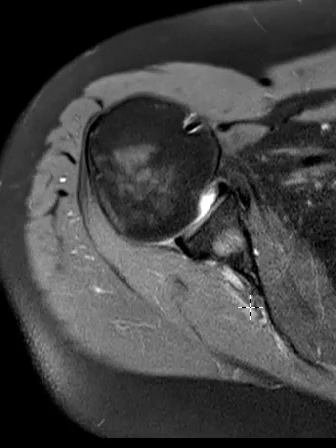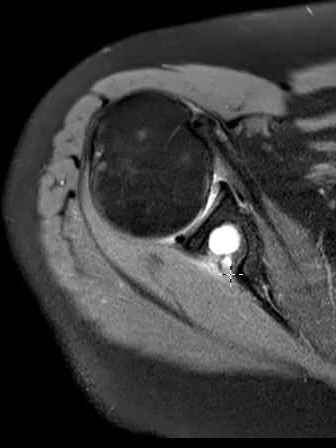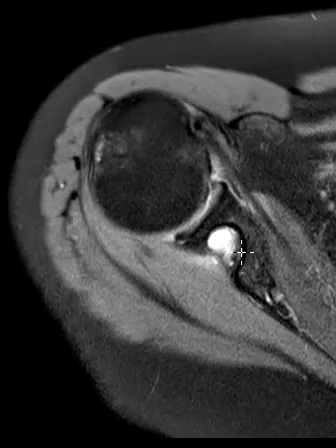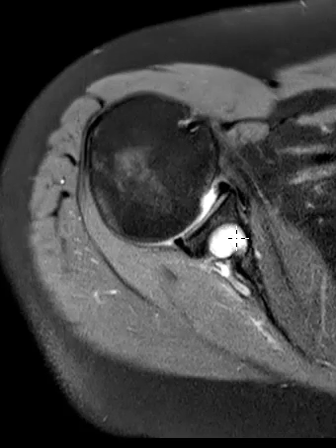Now there's a third thing that's much more rare, and this may be what this is as well. This is a vein back here. You can see it going horizontally across, splitting. And on this view, we see that it looks like it goes right into this. So this may be a venous varix. And this just looks like unilocular.